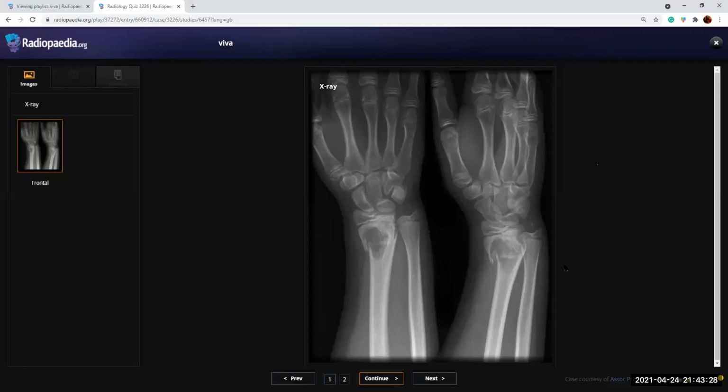In a skeletally immature patient, there could be a number of possibilities, with aneurysmal bone cyst as the prime differential. However, it can also be a simple bone cyst. I would compare this X-ray with the previous radiograph if available, and convey my findings to the orthopedics team for the management of the fracture, as well as for the management of this lucent lesion in future. Okay.